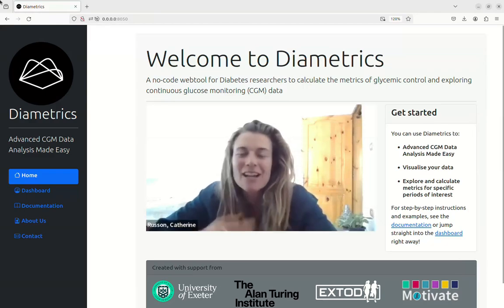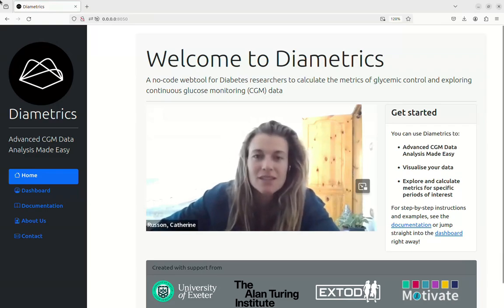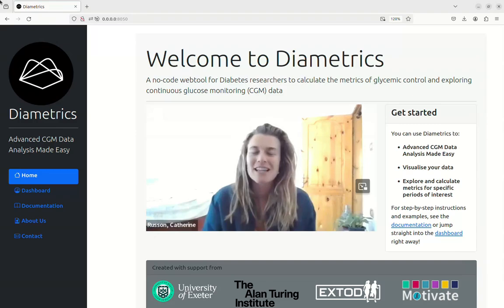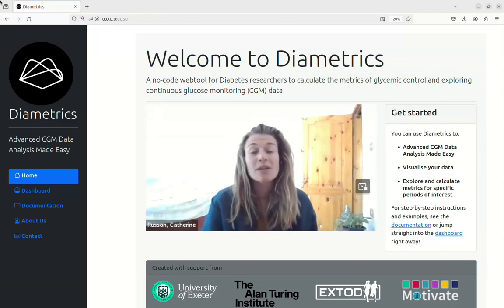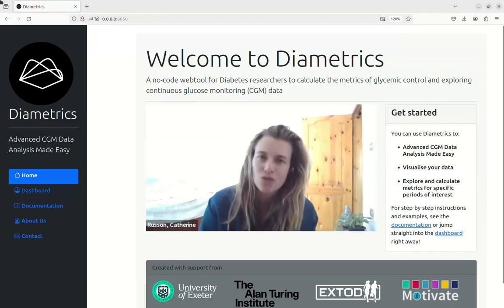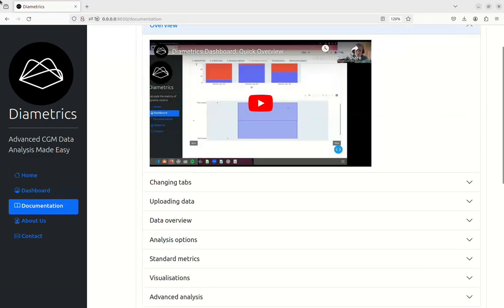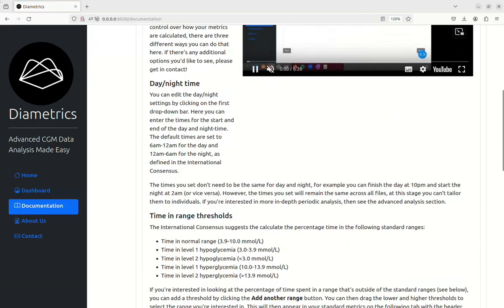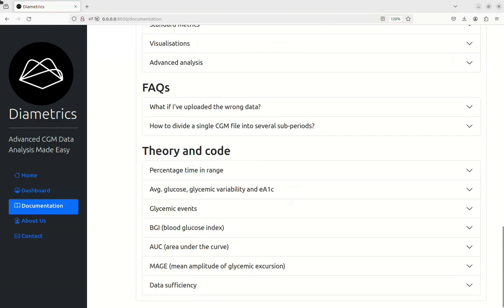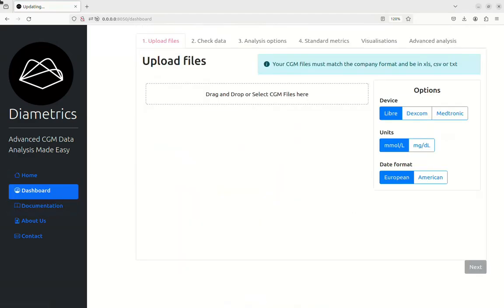When you land on the Diametrics homepage, you'll be greeted by a welcome video that gives you a brief introduction to our project. Diametrics is free to use, open source, and has been validated against established tools in the field. You'll also find comprehensive documentation, including tutorial videos, a frequently asked questions section, and detailed information on the theory and coding behind the metrics. To begin data analysis, navigate to the dashboard.